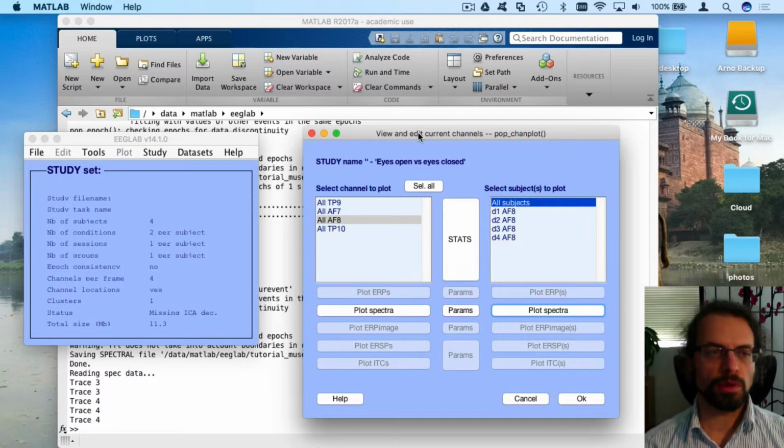So import your Muse file, clean them up. Whatever looks like activity that goes higher than, you know, deviation in multiple channels or a single channel, you remove, because the brain activity is much smaller than that.